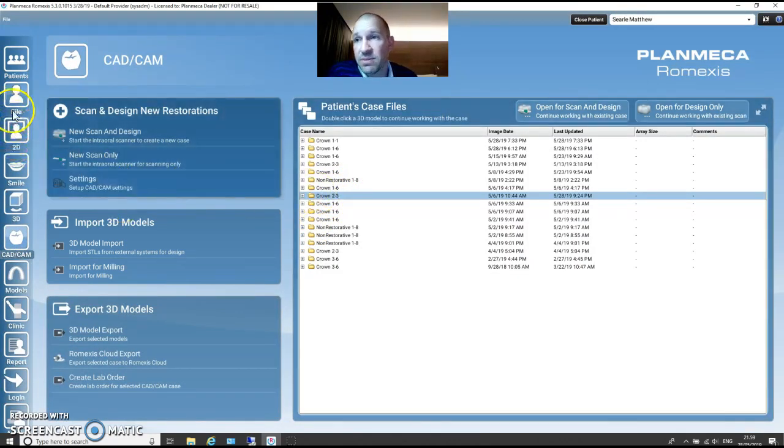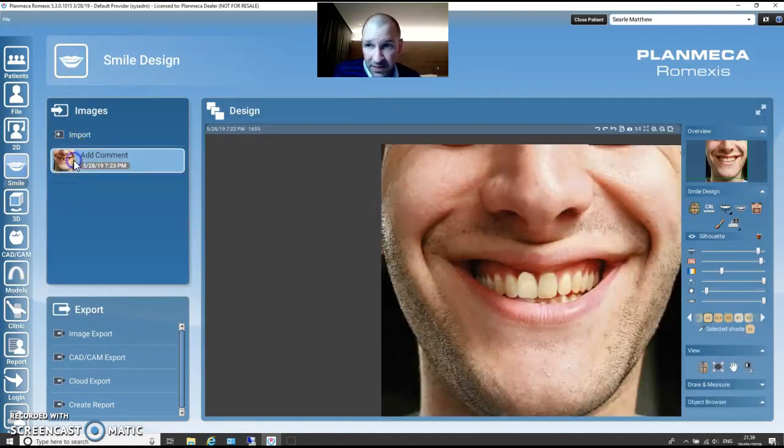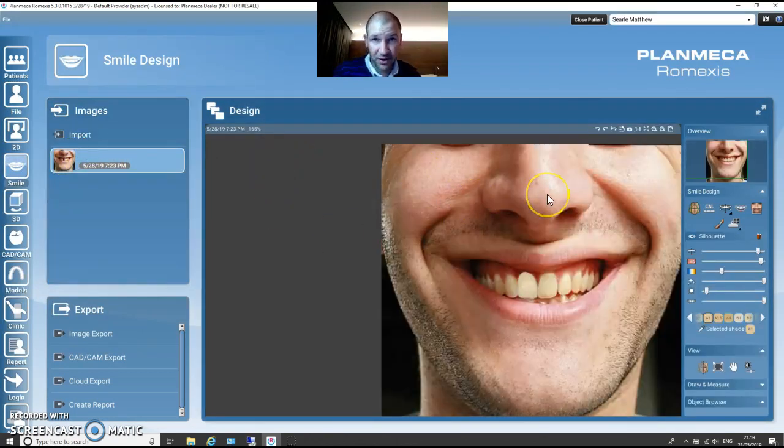Actually, before I go into this, we'll show you Smile Design. So I'll show you how it integrates. So this is Smile Design. If you were to bring in a 2D photo, you get a full image. So you want to try and get the eyes in. This is just one that I've pulled from the internet. But you can quickly point out the eyes, nose, and then you align all the teeth.